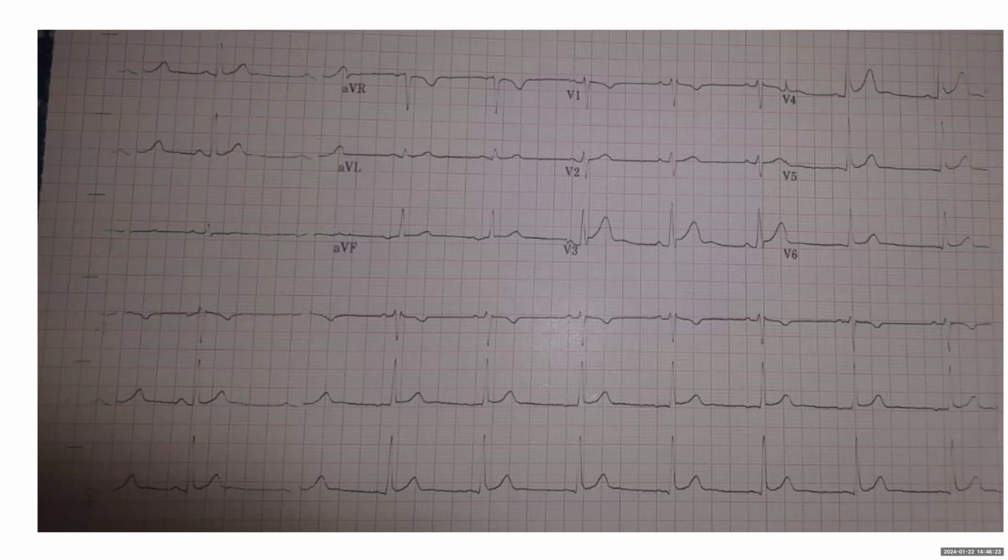And you see a separate high frequency signal between QRS and T. It has nothing to do with being elevated or not. Often overcalled. So in real life, if you're calling something epsilon, you might be right, but more likely to be wrong. Okay, excellent. Any other questions about this ECG?